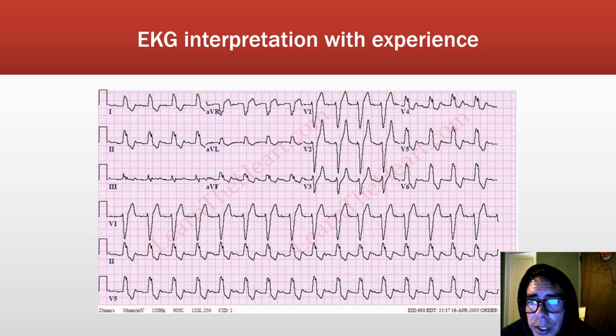Now I'm real quickly going to go through some 12 leads. I'm just going to show how I interpret them and show what you'll be able to do once you watch this basic EKG interpretation, and then my 12 lead one, which is coming out later. This is just with experience, as it says in the title, what you can tell by a 12 lead or by an EKG in general.